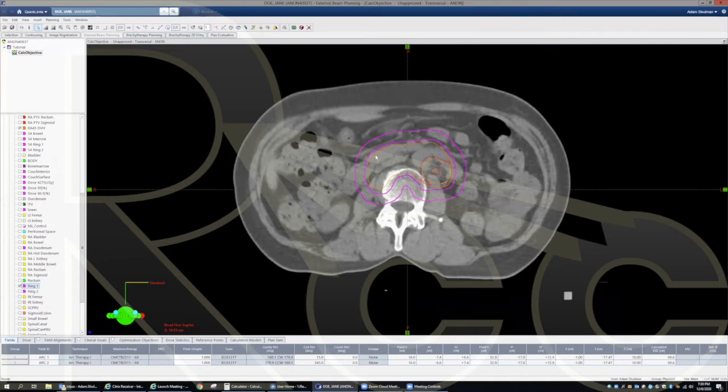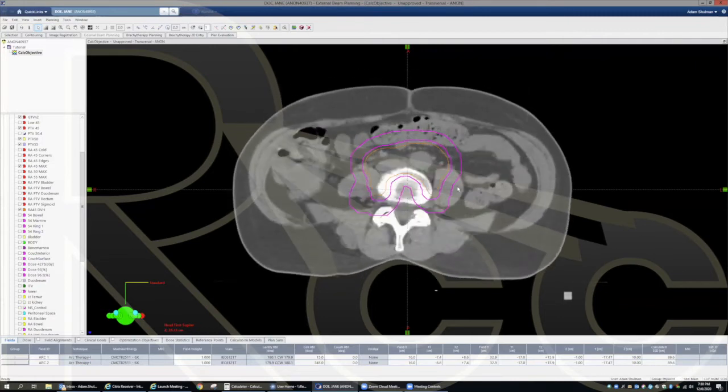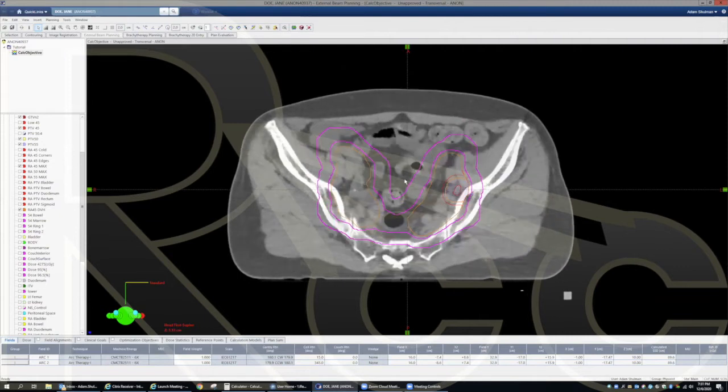So this will be between 95 to 100% at this boundary. And this one, which I've done 3 millimeters away, 5% per millimeter, I'll put a max dose of 85%. And we will want to make these a little bit bigger around these PTVs. So here we've got, which was not done before. I apologize, I should have had this set up earlier.